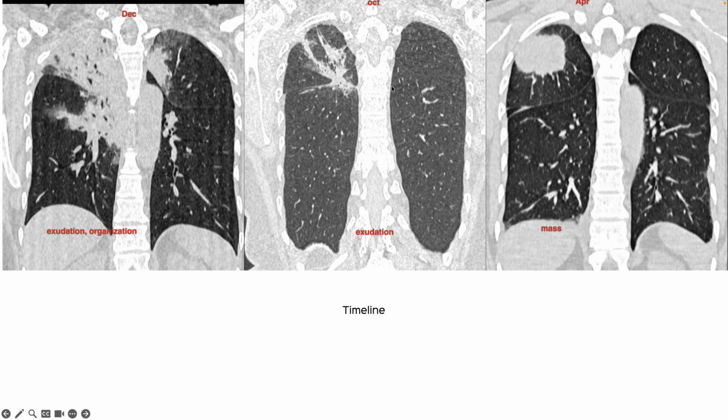While the left upper lobe was not involved in October, and the radiotherapy ended in July, 2.5 months later there are post RT changes around the lesion, and then 6 months later, along the timeline, there's been a flare up, and that is known, where we have from an exudative phase, an organization phase, and progression, which is also known to happen and involves the left upper lobe. Everything is along the portal, including the lesions in the right middle and lower lobes. Again, not respecting anatomic boundaries.